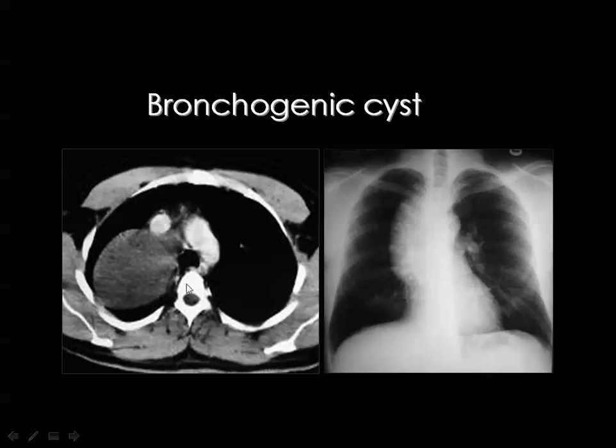Then look at the CT scan and you see a cystic lesion, and this cystic lesion is mostly found in the lung. And anyone can assume that this is a water-containing lesion in the lung, diagnostic of hydatid cyst, as we have mentioned before. But if you look carefully, you can see this cyst is insinuating itself between the superior vena cava and the ascending aorta. If this is a pulmonary lesion, it would not go in this very tight location.